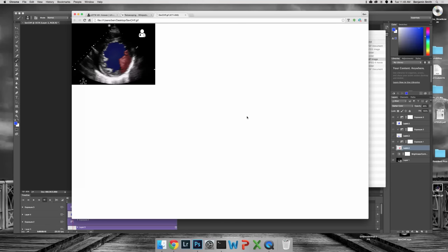So now you've got a clip there that's just colorizing the one segment of the heart, of course, and the lumen as well. And this technique, you have to tweak it and play with it. You may have to adjust your clips to get them to look just right, but that's basically it.